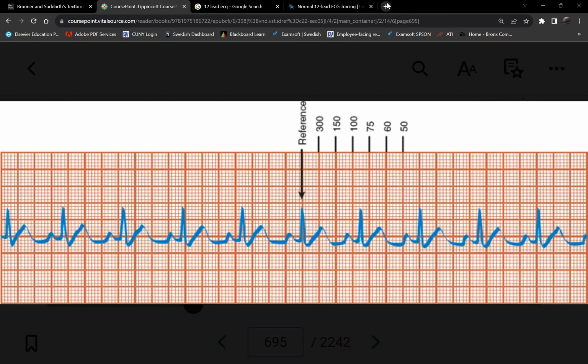Yes, so do I say this is 80? No, because remember, this is part of a heartbeat. This is 3/4 of a heartbeat. So is this really 80? What is it? 80 something, right? We know it's between 80 and 90. Can you say it is 90? No.